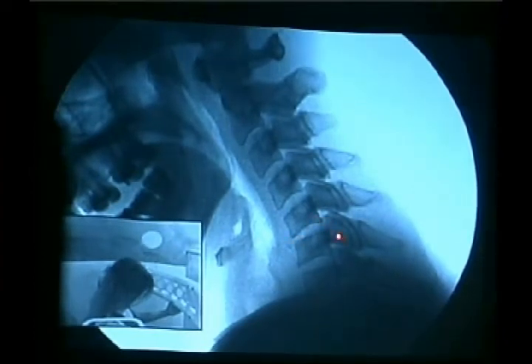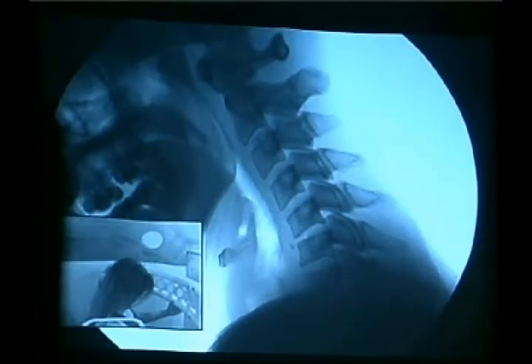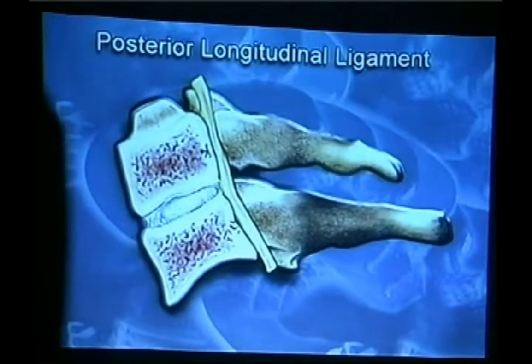That's an increased disc angle, which indicates a posterior longitudinal ligament injury too. So she has an anterior and a posterior longitudinal ligament injury permanently. Young girl, never be the same. Chiropractor kept adjusting, 30, 40 times. And I said, well, it's a chronic case. She's going to need chiropractic for the rest of her life. But at least now we can have someone pay for it.